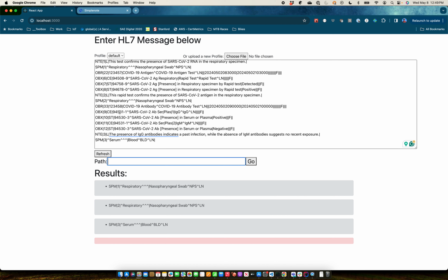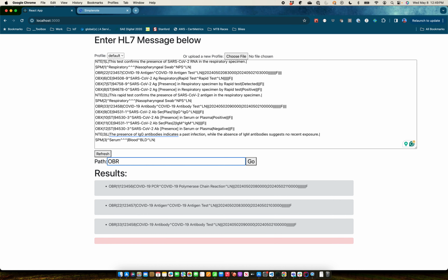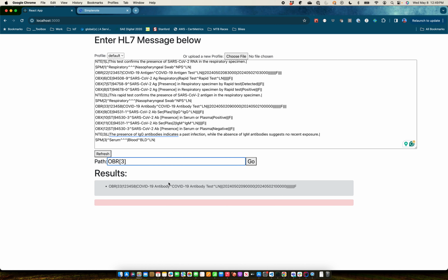One is a shortcut. So sometimes I want the last OBR, right? Which in this case is OBR3. But if I want the last one, I would have to give me all the OBRs, count how many of them, so I can know I can stick a 3 here as the index and retrieve that one. So as a shortcut, we can do last, and you get the same OBR3 as last. Of course, first is just the one, so no need to have a shortcut there.